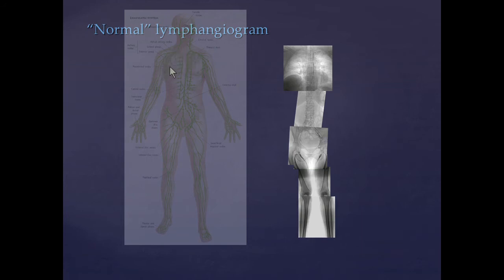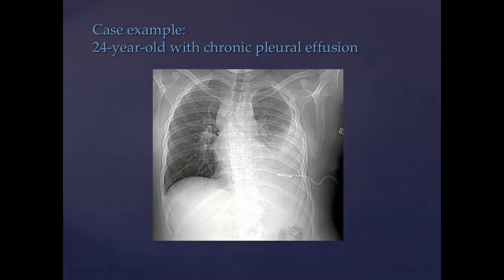But it clearly explains why some patients will develop large chylous effusions after thoracic surgery on the right side only, and you're like, well, the thoracic duct's a mile away, how'd you hit that? And it's because they've gotten into one of these major trunks that exist there naturally.